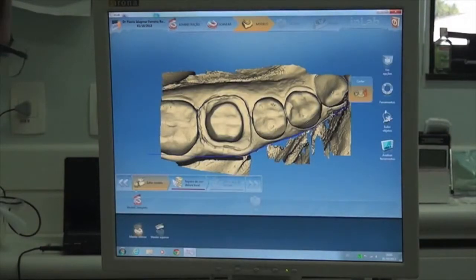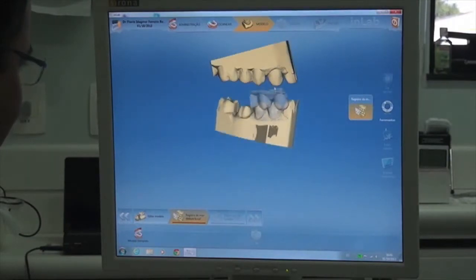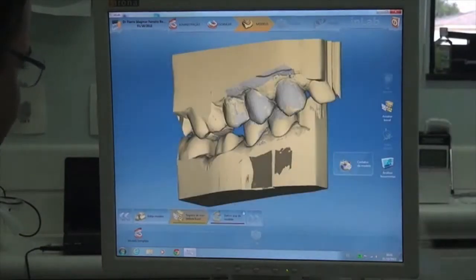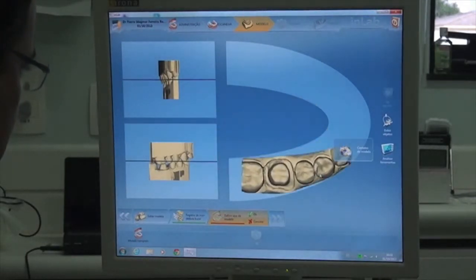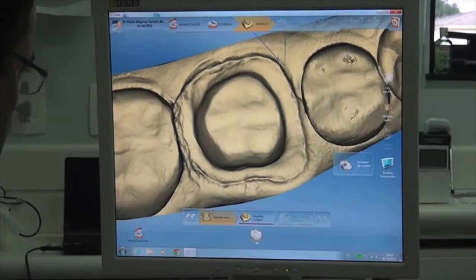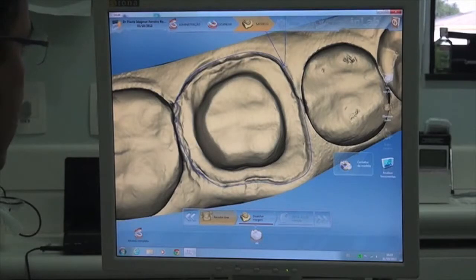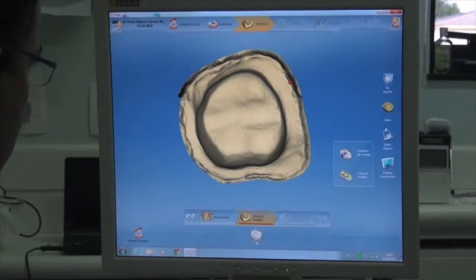Cut, and then mounted on an articulator. In the next step, the created model was positioned in the software arc, the insertion direction was defined, the die was cut, and the cervical margin was identified.